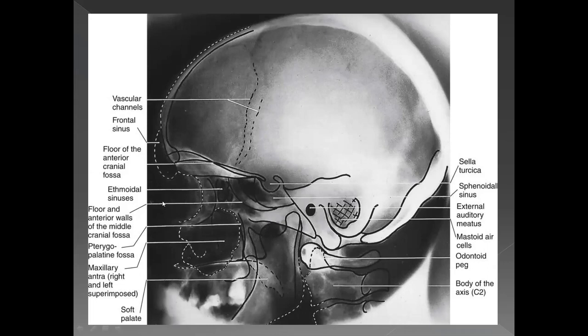And if you look very closely, maybe you can see the tip of the bony part of the nose over here. It's not very clear, but let me see if I can brighten it up for you. Again, not very clear, but you can see it.